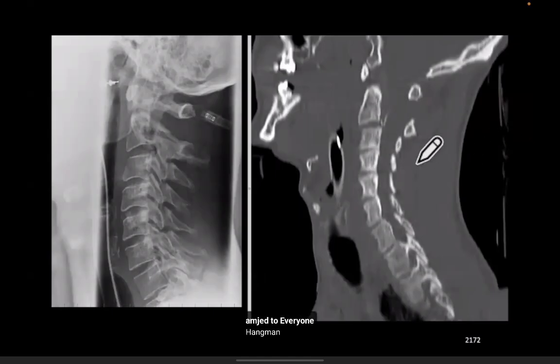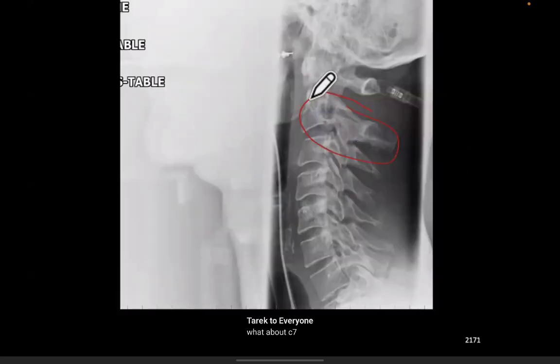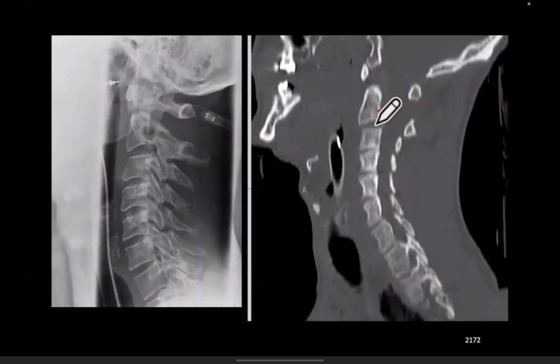And you can actually see that the anterior longitudinal line is relatively okay, but there's a step when we go up the posterior longitudinal line. So there's a step just there. And so there's a fracture posteriorly, fracture anteriorly along that facet line. There you go, I've drawn it, and there's the soft tissue swelling.